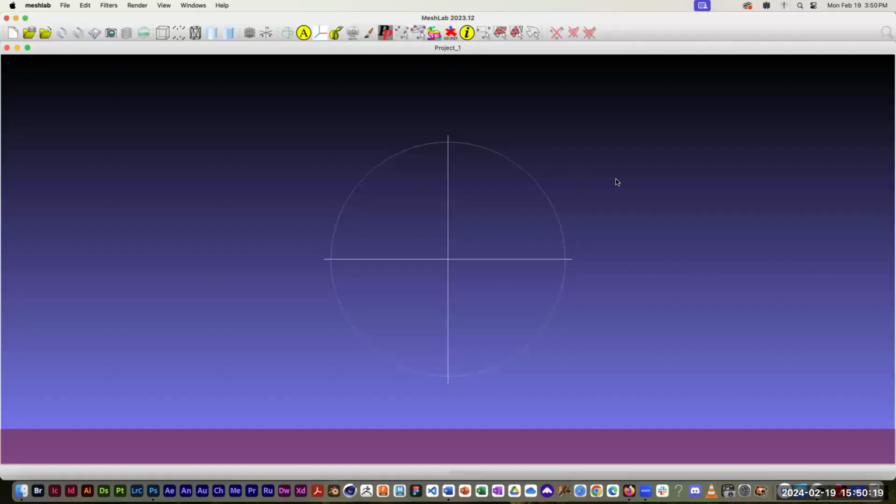All right, so this is MeshLab, which is actually a wonderful tool for cleaning up really hideous meshes that have bad polygons and all kinds of stuff. We're going to use it right now just as a way of doing a really quick and dirty render of these models. Plus, we can actually smooth them out a little bit. That's one downside to the segmentation process, is that it oftentimes retains kind of a stair-step appearance because of the stack of slices. So you can actually get rid of some of that here in MeshLab.